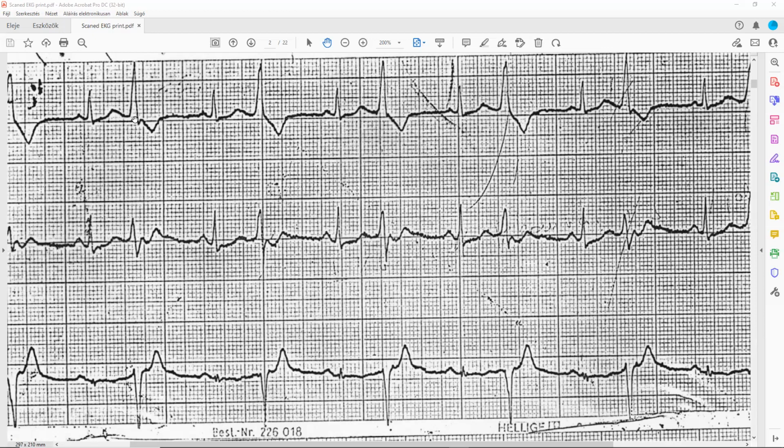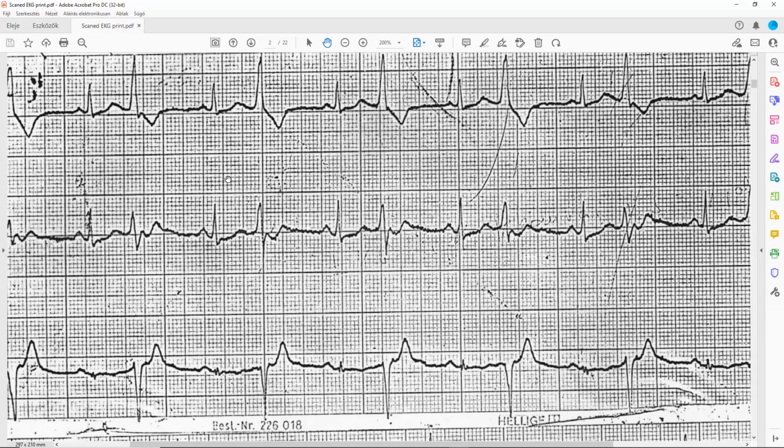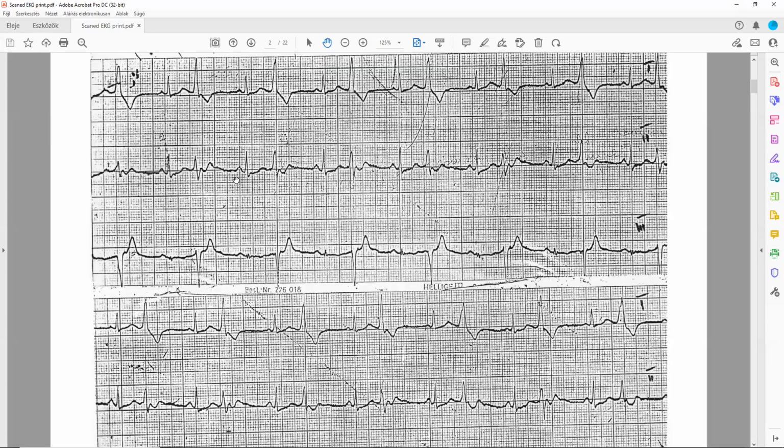I don't remember the name. That's a bigeminy. Ventricular bigeminy. Guys, you should watch the videos. At least the theories you should know. I watched it, but it's hard to memorize the name of it. Sorry. You should make some notes, or you can download my notes as well and use them. So this is a ventricular bigeminy.